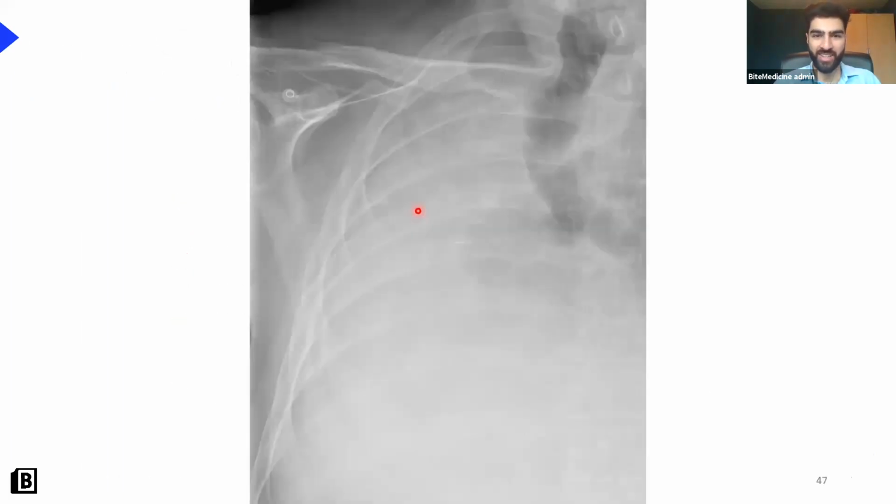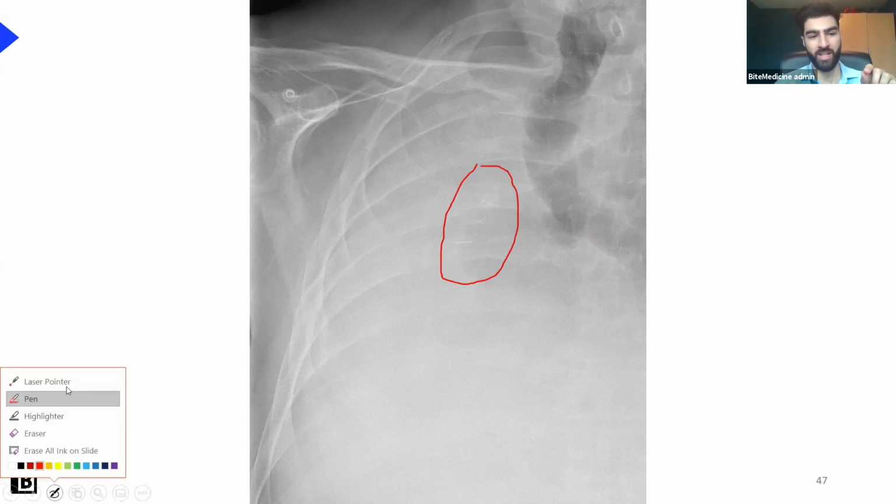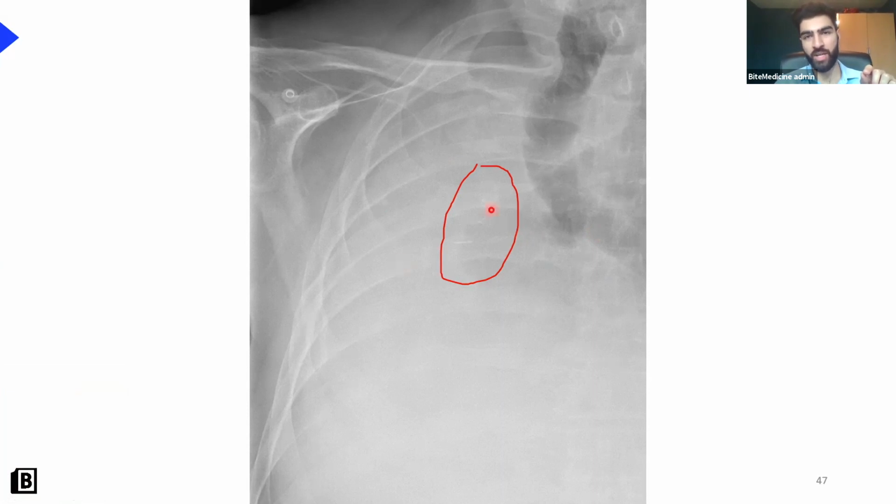I'll show you why. So if we zoom into this, what do you notice? So this could be collapse or a pneumonectomy, but what do you notice? That's there, that shouldn't be. What do we always look for before? Yeah, so you've nailed it. You see clips. You always look for lines and metalwork, etc., before looking at the lungs. I don't know if you could see that properly, to be fair, on your question, so it was a bit unfair, but there are surgical clips there.